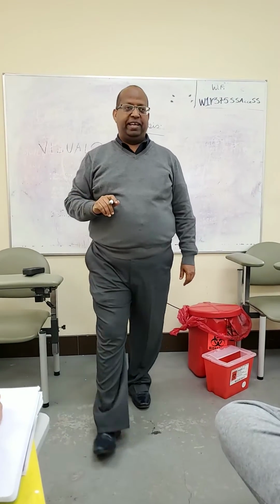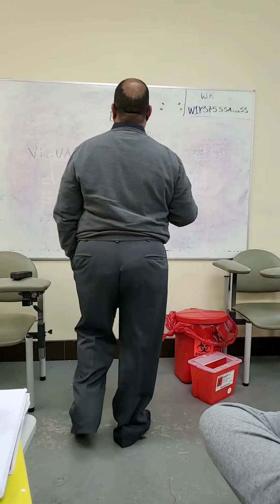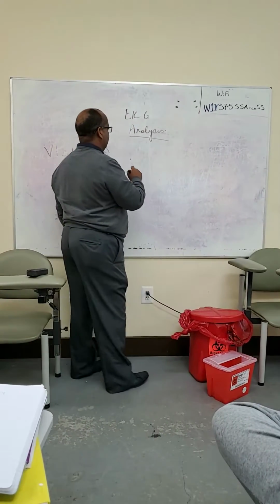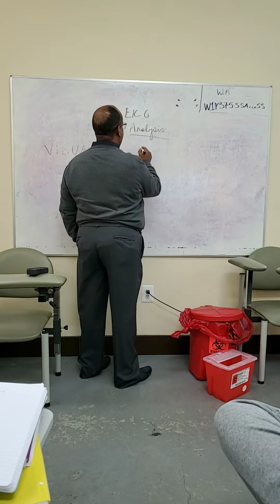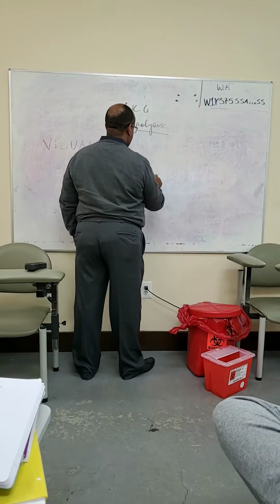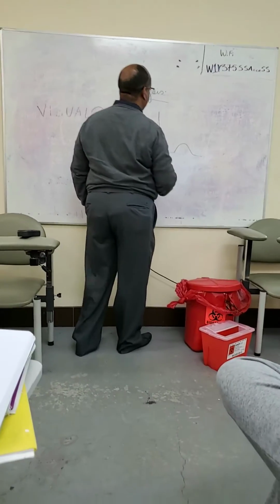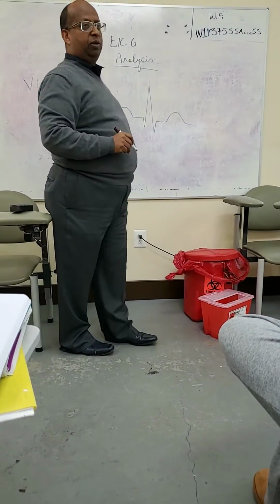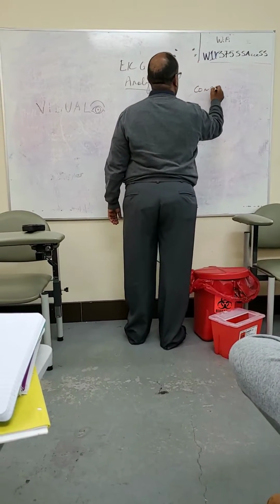Okay, on EKG analysis. So, where do we start first? First, let's start on the basic form of the EKG, the strip, okay? First we have to know what the components of our EKG strip are.